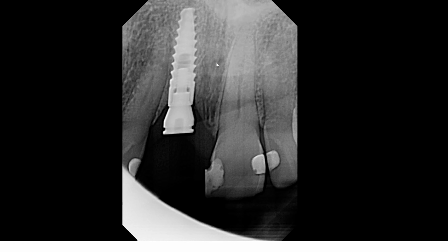But I think this is an interesting topic to discuss, and again, it emphasizes the importance of getting a cone-beam CT image in order to evaluate surrounding anatomic structures, in this case obviously the adjacent teeth, but also the nasopalatine canal. Additionally, we would also have to consider the buccal concavity that's typically present in the maxillary anterior maxilla. So I hope you learned something new about how I go about evaluating implant placement, as well as just two-dimensional images.